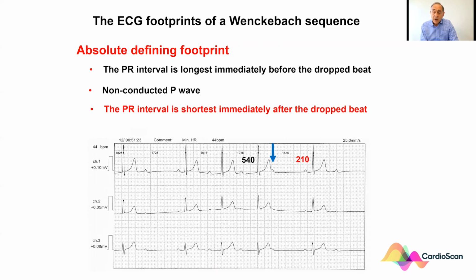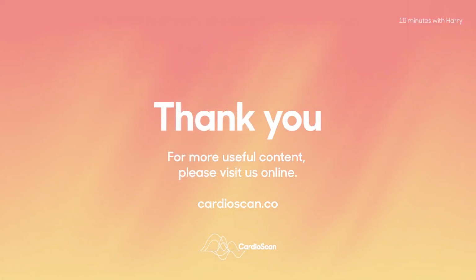Well, when we look at Wenckebach sequences in everyday ECGs and Holter monitoring, these three features are the features that make us understand and diagnose Wenckebach. The progressive prolongation is also important, but is often not seen.